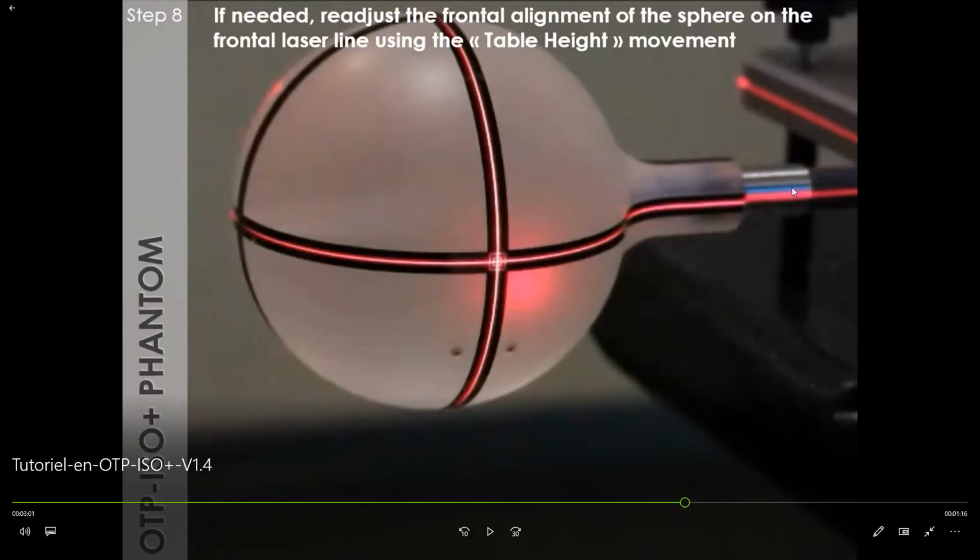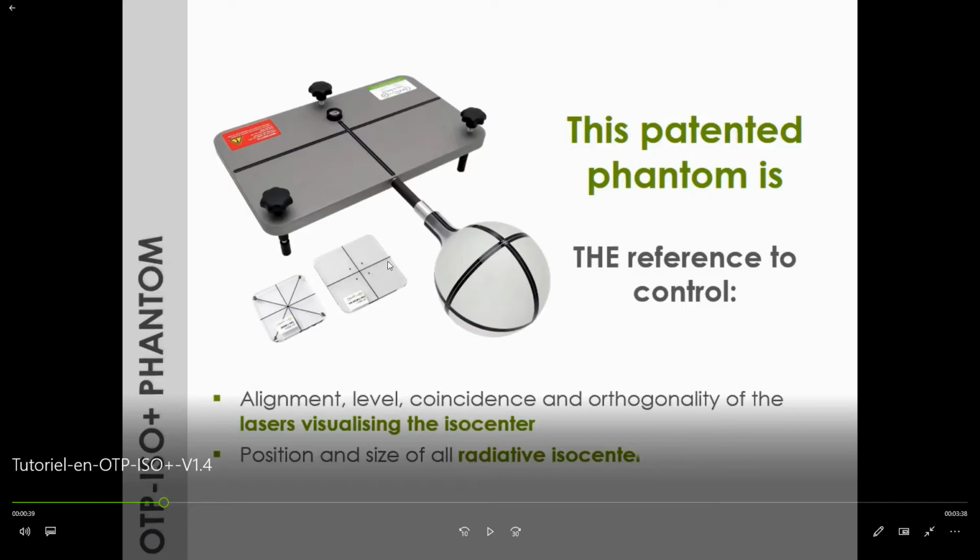For the metal ring, given that the object is placed on the couch, when the object rotates, the ring will rotate, and as the ring is detected in the image, we can determine the couch rotation angle. Insofar as the collimator is concerned, I will return to the video.